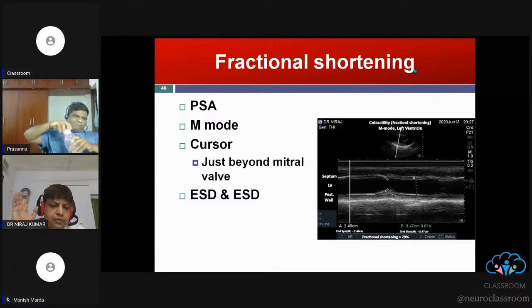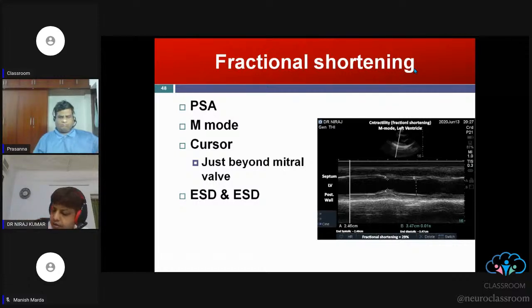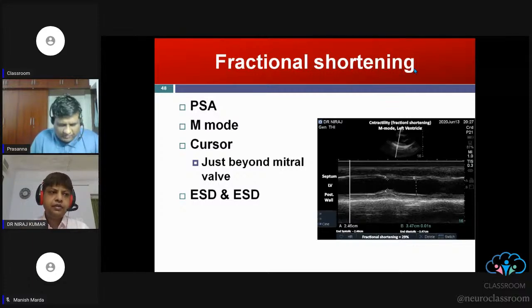And the last part is the Simpson method. The experienced cardiologists do the Simpson method. The Simpson method is a little bit difficult and cumbersome. But besides that, there are also some simpler techniques, fractional shortening, then EPSS, and then the VTI method, that an intensivist can perform and have a rough idea about the contractility.